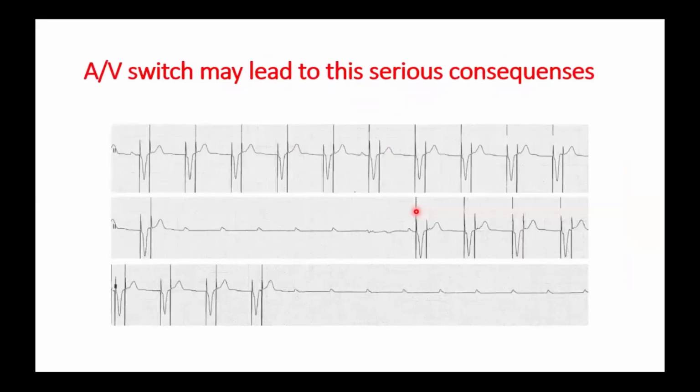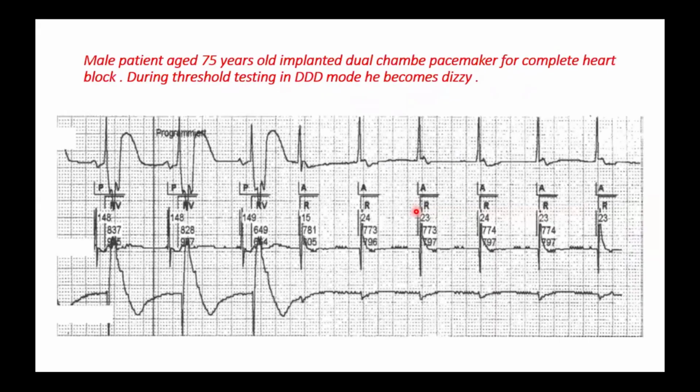So this is another differential diagnosis. This is a problem, but it's very important to know and identify, because it's actually fatal.